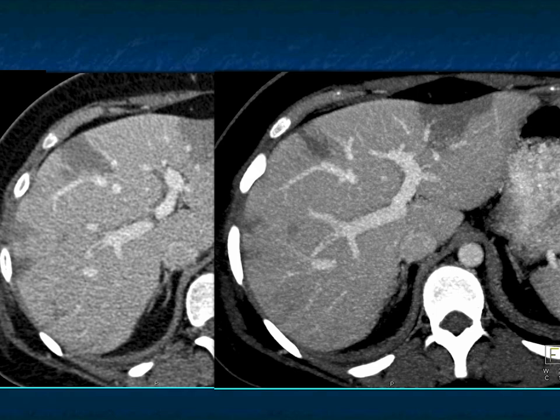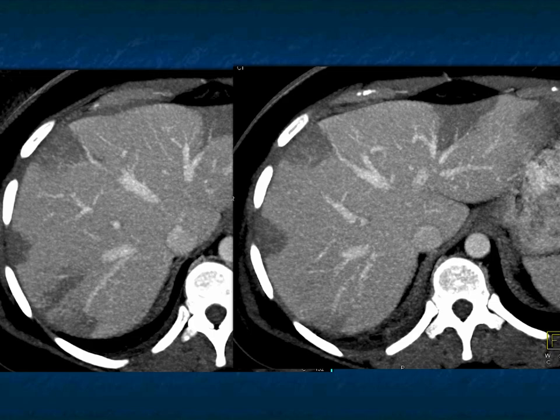Very nicely shown, multiple examples, sharply marginated, often seen best on venous phase imaging. You can really accentuate them very nicely with the MIP as well. A really nice example of multiple hepatic infarcts.